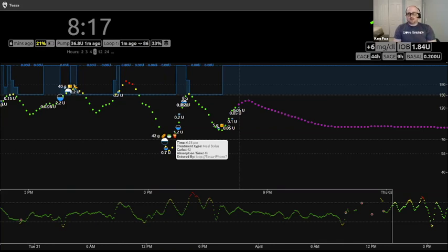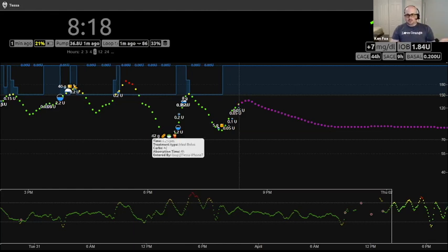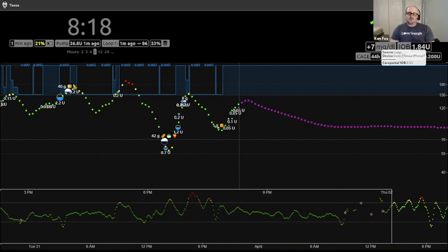There's a lot of things in Nightscout that are visible by tapping or hovering your mouse on. So make sure you're just doing that as you're clicking around to see what's going on. So with that, we'll move on to the pills, because that's one of the things that are really important. So the pills are these little boxes up here. If you hover over things, you'll see different information.